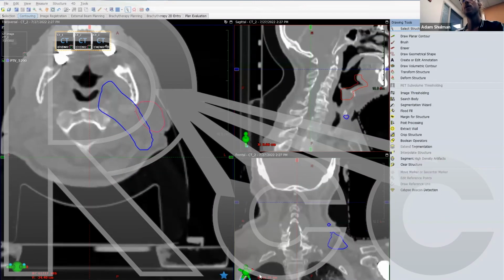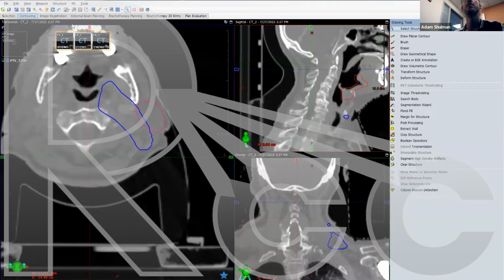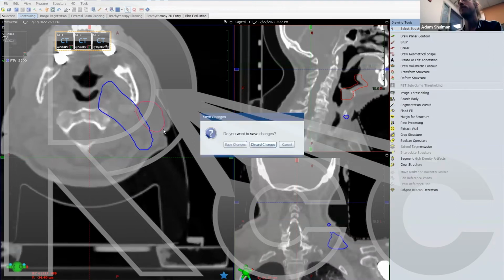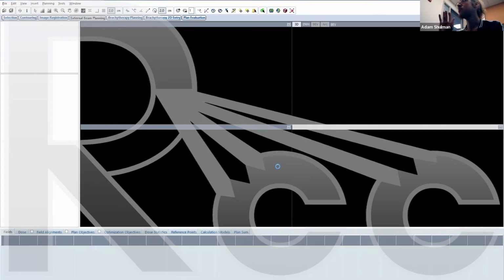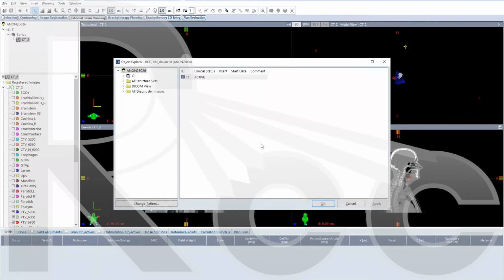So I'm going to quickly go to a little bit of optimization just to sort of show you some of the ideas of the optimizing process. This is the idea of the contour. So get your contours perfect. If your contours are perfect, the optimization should be really easy. If you find that you're struggling with the optimization, go back and reassess your contours. Our rules work. It never takes me more than one time to do a plan to get a perfect plan. And it usually takes start to finish contours and planning maybe an hour and a half.